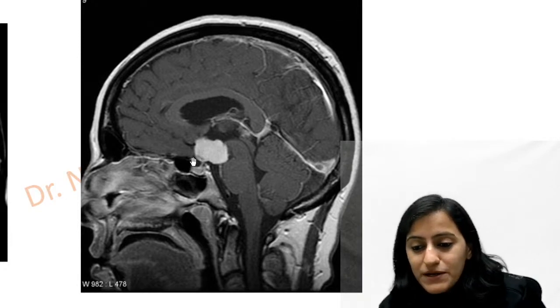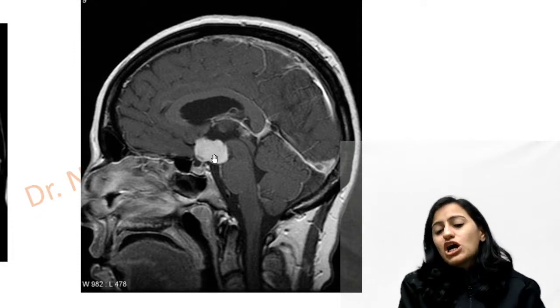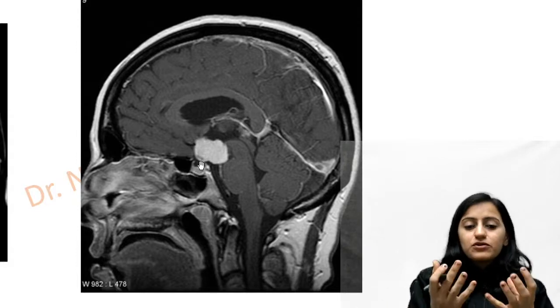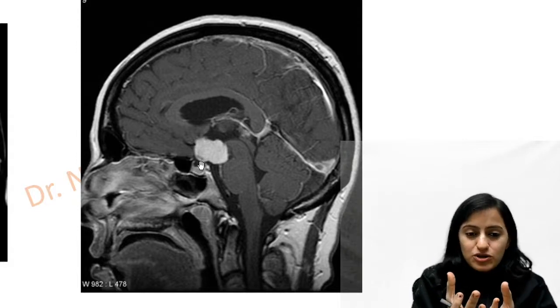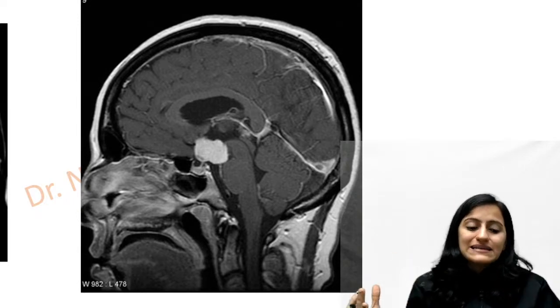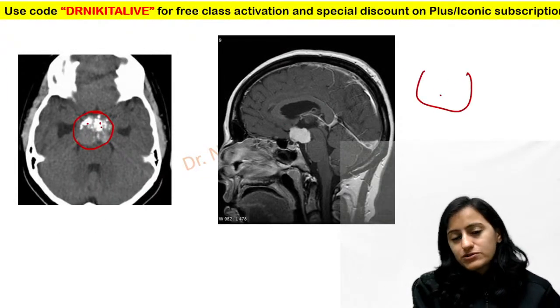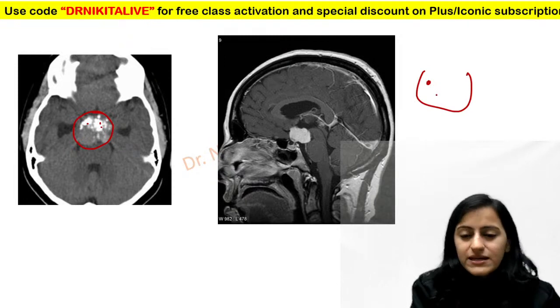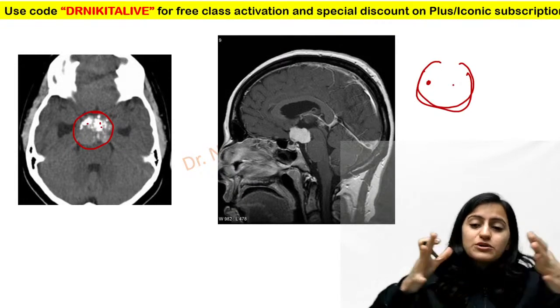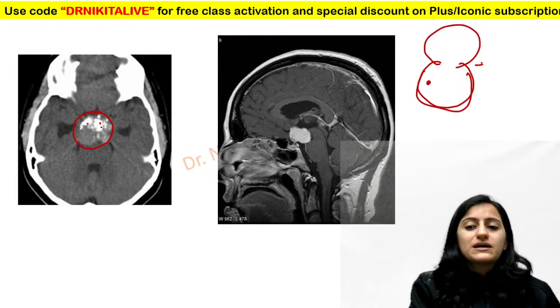Okay, so predominantly it has a suprasellar component. Why is this not pituitary adenoma, Bhagraj? Yes, we are coming to that. Why will this not be a pituitary adenoma? Because pituitary adenoma grows from the pituitary, so it will cause pituitary fossa enlargement. The sella widening would be seen, right? If this is the pituitary fossa, the adenoma is within it. It could be small, a microadenoma, or it could be large. So it will cause the sella enlargement, and then it can go upper into the suprasellar component.